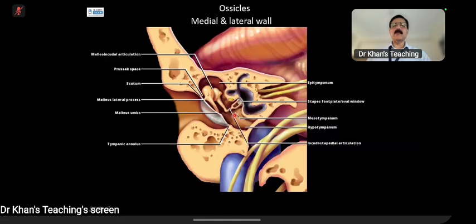This is the mesotympanum. Superior to this, which is this one, is the attic or the epitympanum. And inferiorly, this trough-like area, which has got nothing there, will be known as hypotympanum. So this is a global view of the middle ear. If you see superiorly, there is a bone here which is known as tegmen tympani, and superior to that is the brain. And this bone becomes FRCR bone because they will show you cases in which it is eroded, and you have to tell the examiner that this is eroded. So scutum has got importance. This tegmen tympani has got importance.